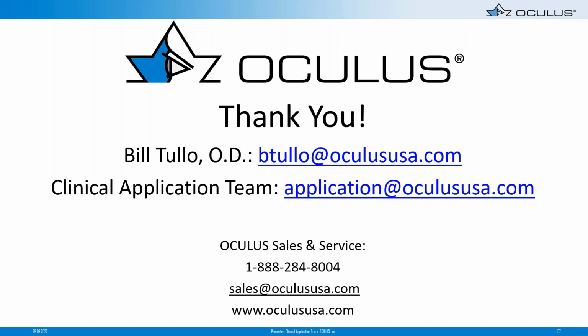But contact lenses can have significant effects, and so can scleral lenses. Even though they're not touching the cornea, they can have significant effects also. I usually like to have scleral lenses out of their eyes for at least a day if I'm going to take measurements of their cornea, especially if I'm considering IOL calculations or anything that's very crucial that can determine the outcome of a surgical procedure.